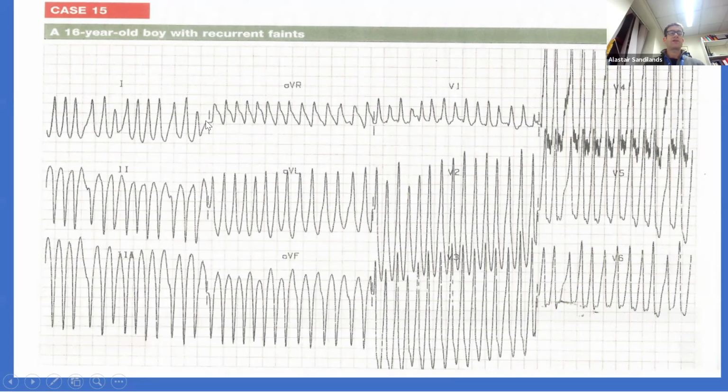Okay. And so this is an example where there's atrial fibrillation. There's variable QRS heights. It's penetrating down the pathway by evidence of a delta wave here. There's a delta wave there, delta wave there. So it's going down the pathway through the delta waves. These are pure delta waves. Okay, and you can see it's very fast, 300 beats a minute almost at times. Okay, and that's where the 300 beats a minute comes in with the tachycardia. So this is atrial fibrillation going down the pathway to the ventricles, and it's very risky.